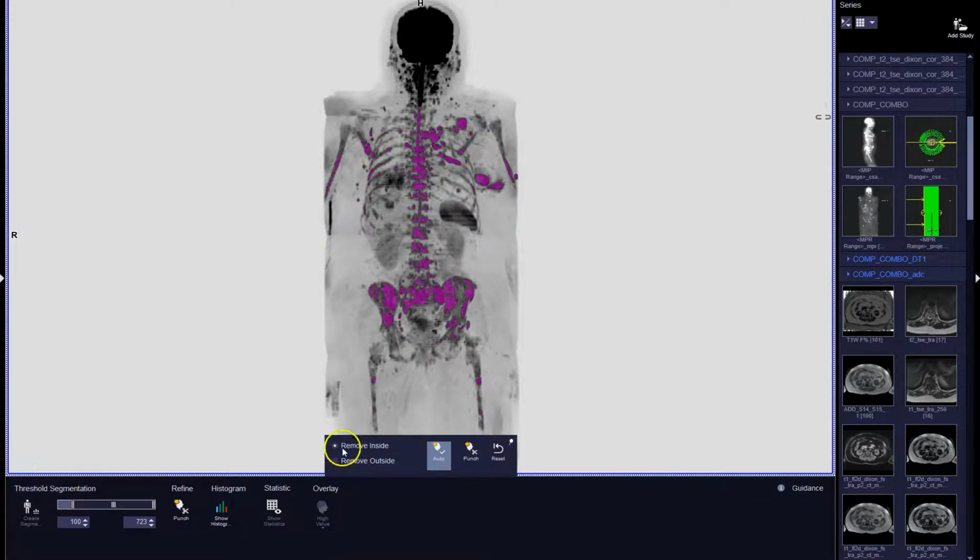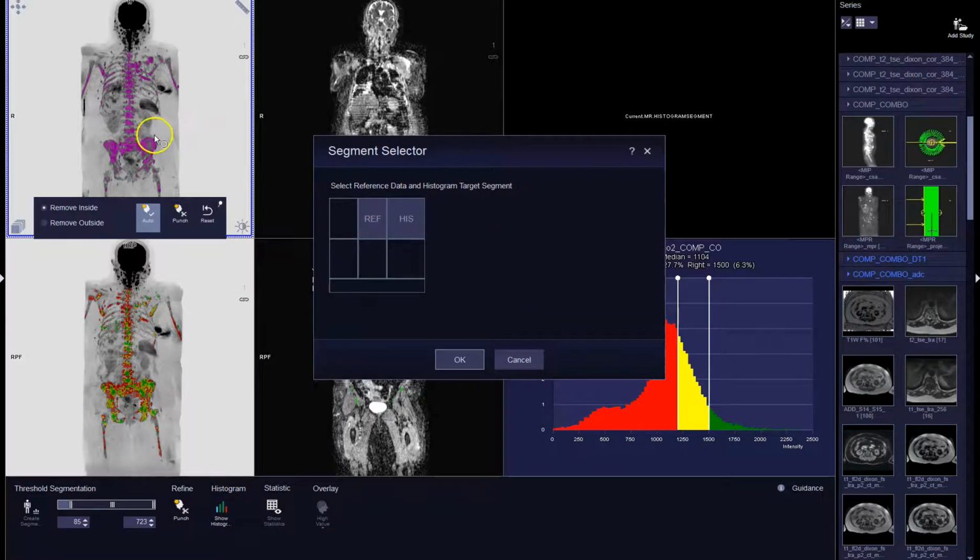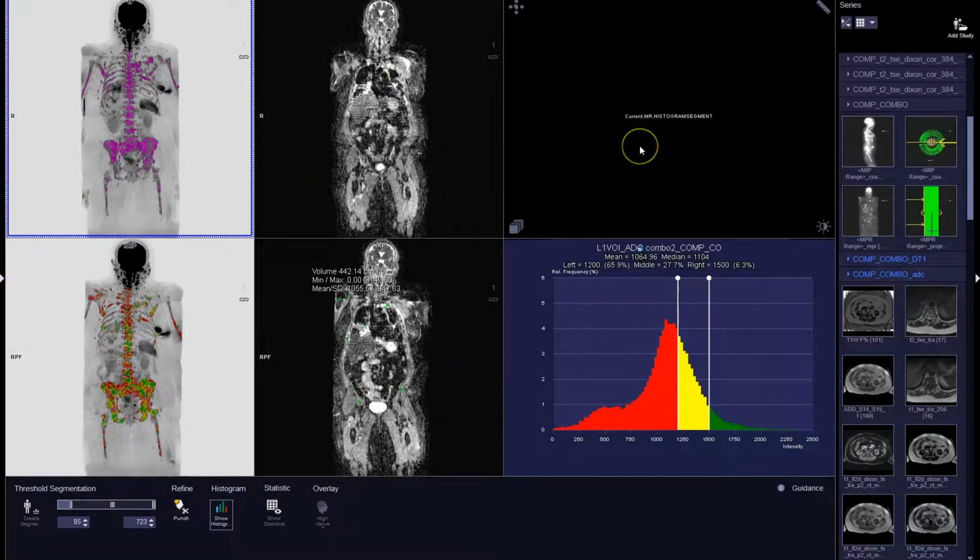Now, as I said, the volume is decreased compared to the last time, so we're going to increase the volume by adjusting the threshold. So we have approximately the same amount of bone marrow. We could probably put in a little bit more bone marrow, adjust that to 85 as the threshold, and there we are. Okay, so we need to adjust and get rid of the disease in the left breast, and that's about the same amount of bone marrow. Double click, create a histogram. That mask will be applied to the ADC map, and the histogram will appear here, and you'll see that appear shortly.